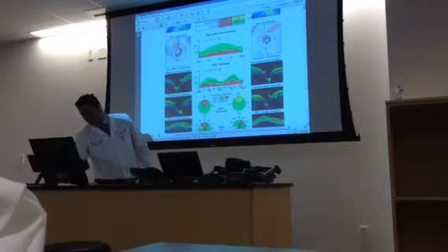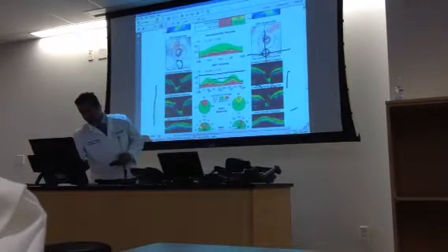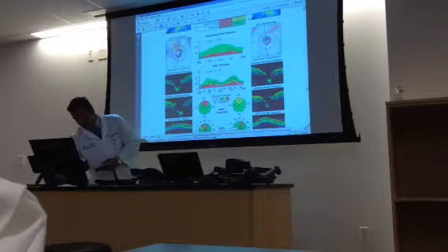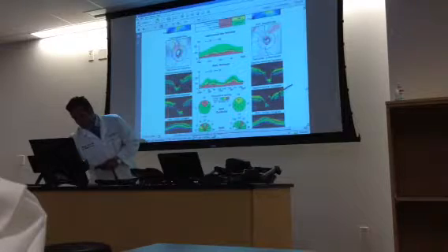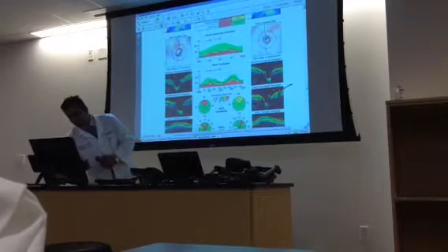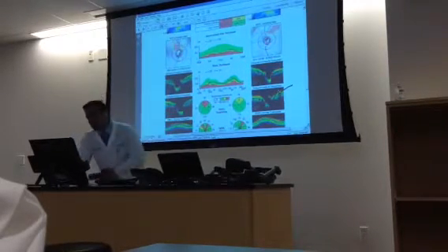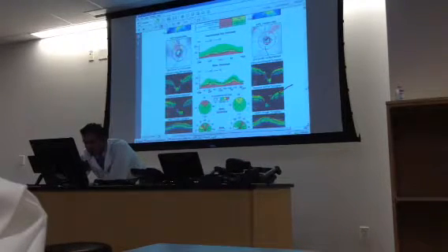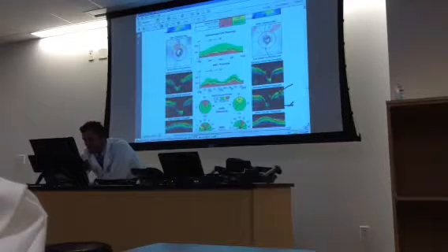Or if you see in this location, in the second, right here, you see how this little tuft of blood vessel is being assumed to be part of the disc, and that's not part of the disc. See how this little bottom blood vessel is assumed to be the bottom of the cup, and it's not the bottom of the cup.